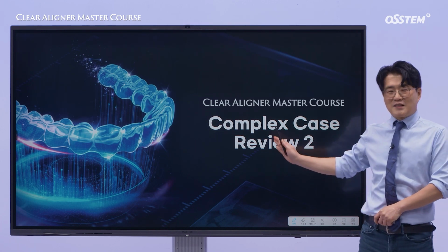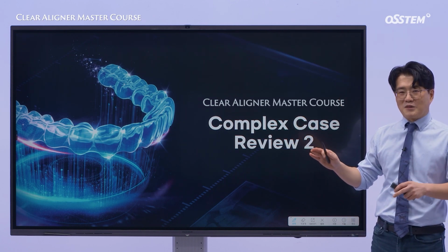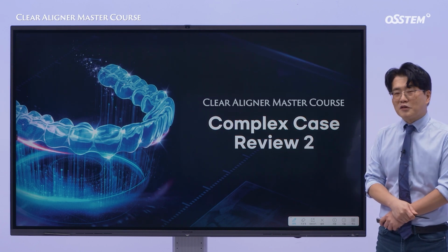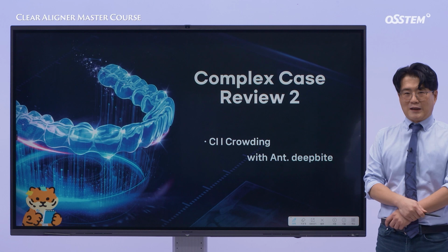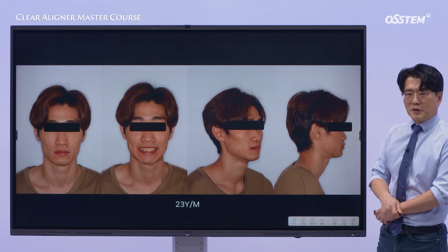In this session, we'll take a look at a complex case. It's not highly complex, but among Class 1 crowding cases, this is one we can work through in a basic course. This is a Class 1 crowding case with a deep overbite.